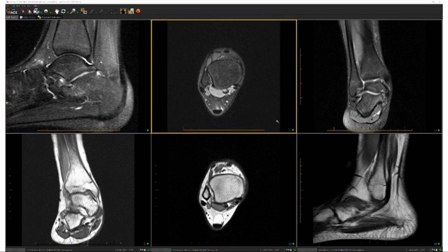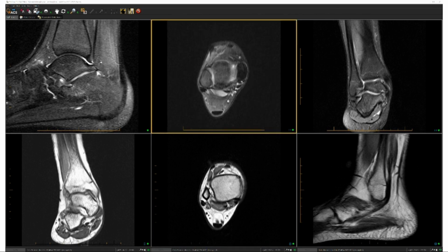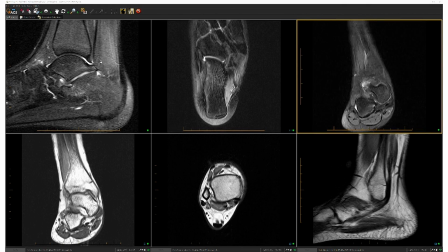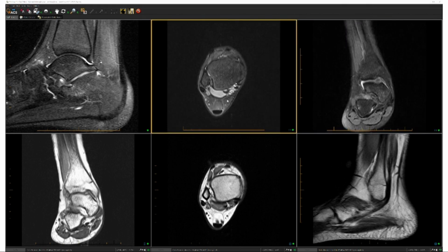So we're going to take a look at the medial flexors. We're noticing that there is medial retromalleolar ossification here, and there is some type of hyperintense signal change within the posterior tibial tendon. We can take the posterior tibial tendon to its insertion. It's slightly tendinopathic and thickened at the insertion, very subtle. And it also has a slight enlargement.